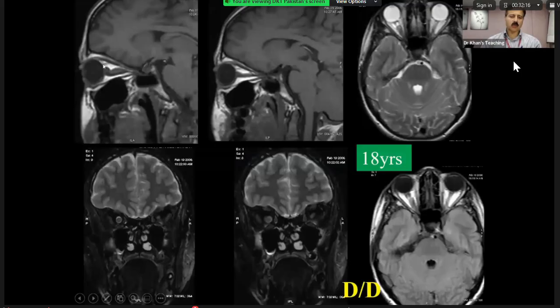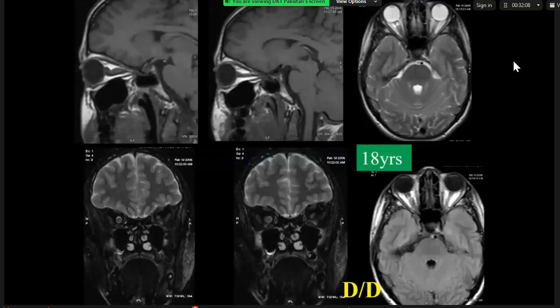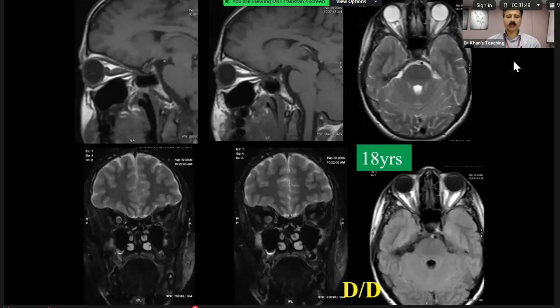Look at this optic nerve and this optic nerve, and what is your diagnosis? The optic nerve is seen on the right side, is seen enlarged. I think this is meningioma affecting the optic nerve, because I could see on the coronal images that there is a donut sign. What would you like to do? I would confirm it with the post-contrast study. So on post-contrast, there was no enhancement. I don't have post-contrast, but there was no enhancement.